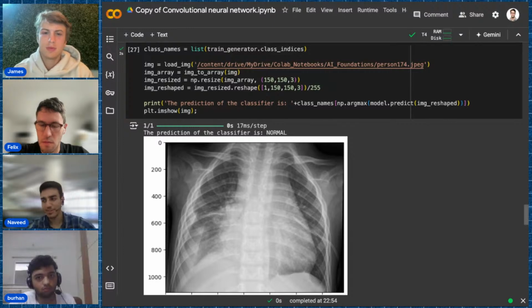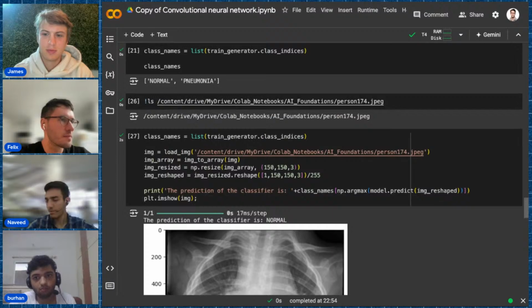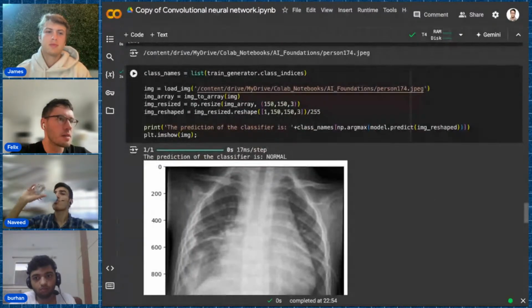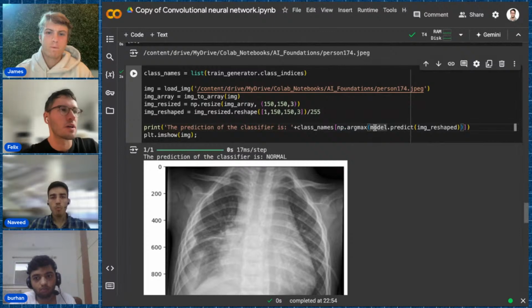It's funny. But so how can we know that? How can we change what you mentioned here so that it's actually correctly printing the right class?